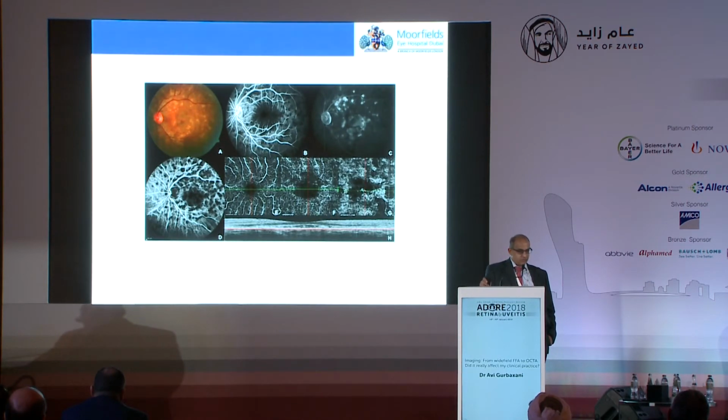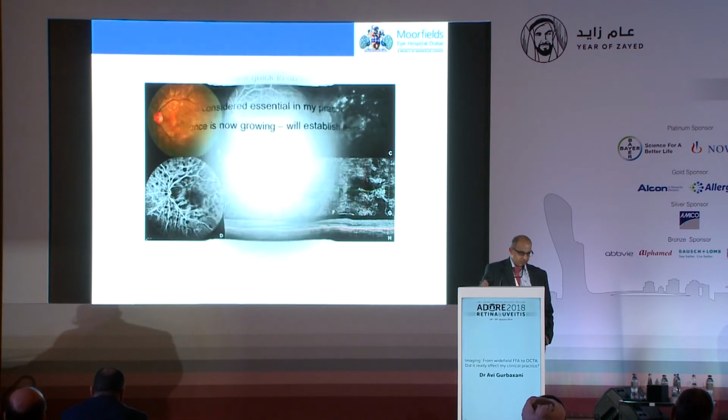So we always think of these diseases where you need to have leakage, so you need to have the dye to demonstrate, but actually, as we are seeing, you can see corresponding changes in the OCT angiogram as well. So I look forward to using OCT angiography more and more in my practice.